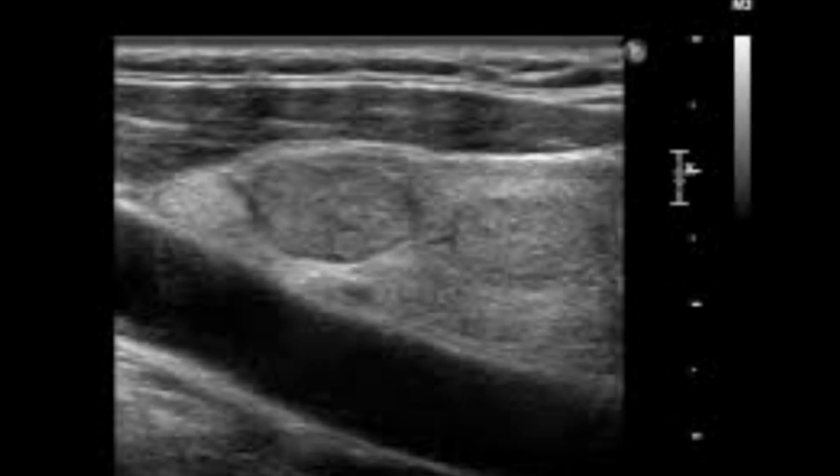The next important sonographic feature is both having a surrounding hypoechoic halo. So this surrounding hypoechoic halo makes it benign. So this is the characteristic of a benign lesion, and you can apply the British Thyroid Nodule classification as U2.